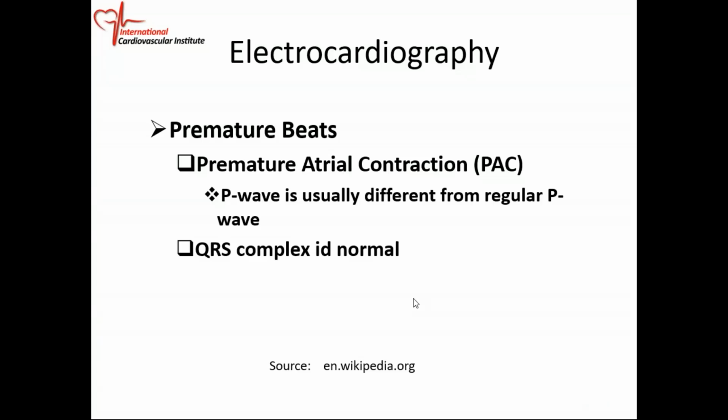Okay. All right. So this evening we're going to look at premature beats. First, we're going to look at premature atrial contraction. We call it also supraventricular premature beats. We're also going to look at ventricular premature beat and how to distinguish between the different premature beats.